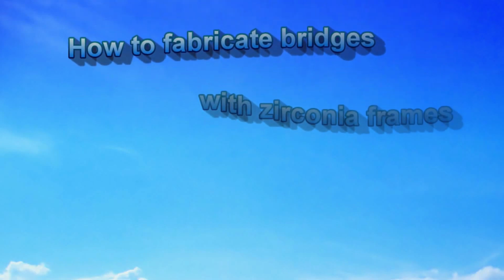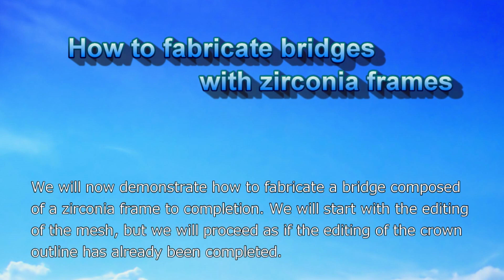How to fabricate bridges with zirconia frames. We will now demonstrate how to fabricate a bridge composed of a zirconia frame to completion. We will start with the editing of the mesh, but we will proceed as if the editing of the crown outline has already been completed.